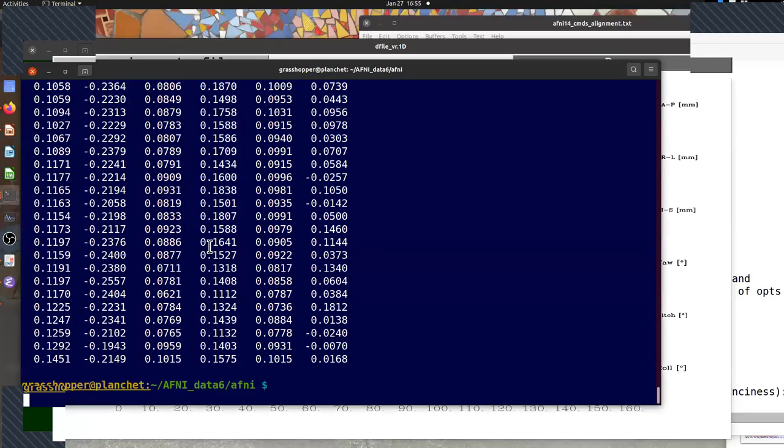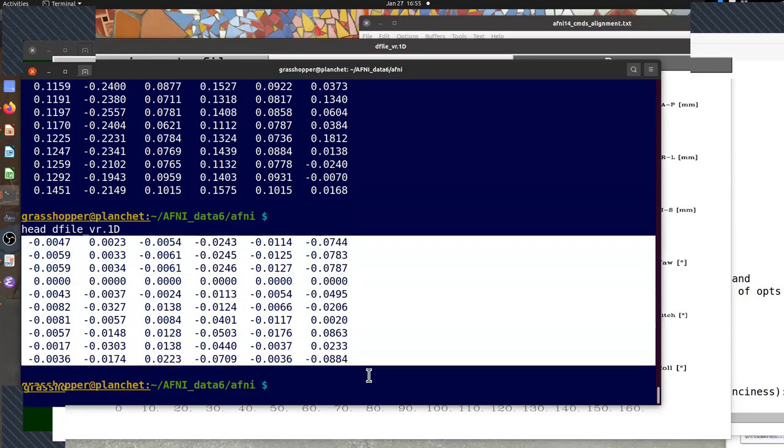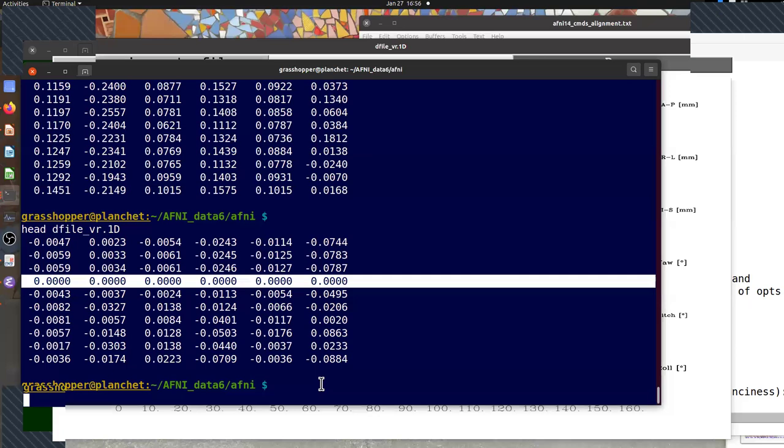If I look at just the first few numbers here, the head command shows me, I think, the first 10 rows by default. Do you notice anything particular about any row of numbers when we're looking at these 6 motion parameters? So this is delta AP, right-left, inferior. Looking at numbers isn't always the most fun thing, but actually one row pops out at me, this one.